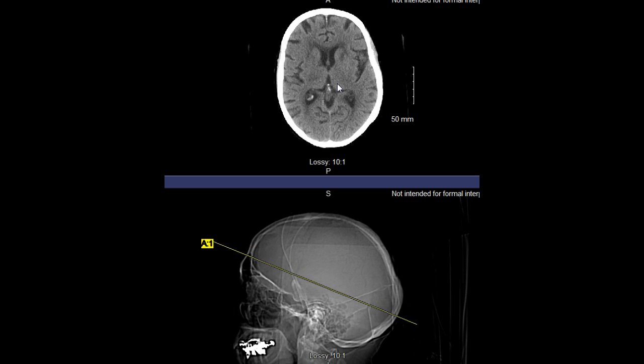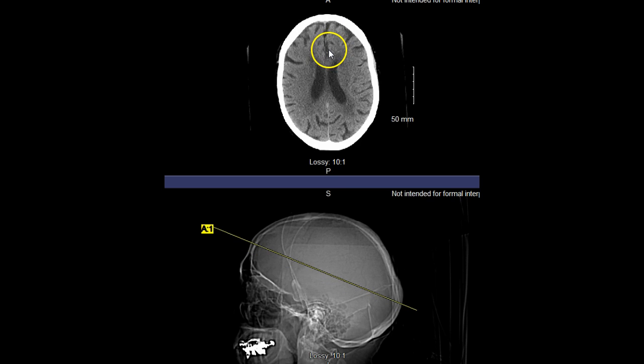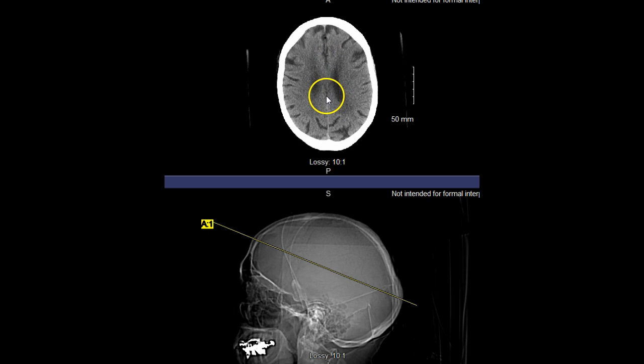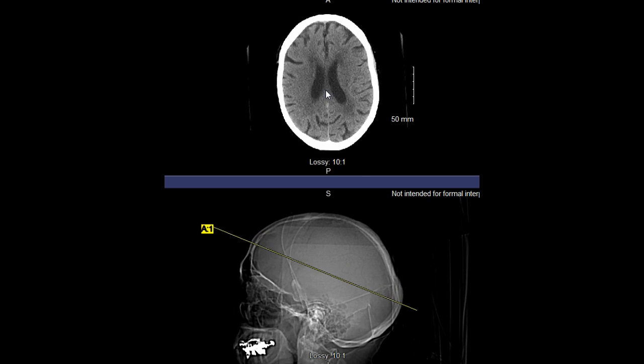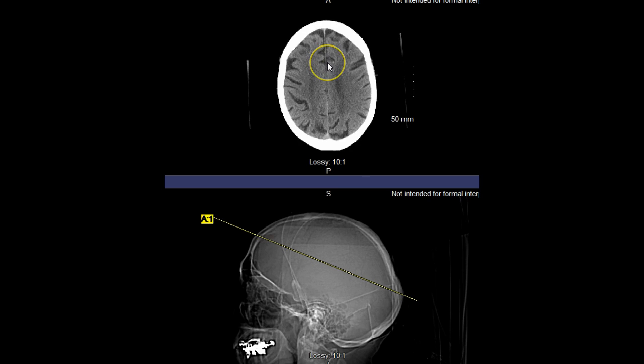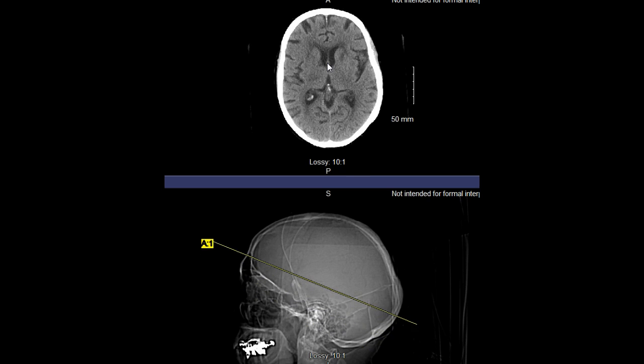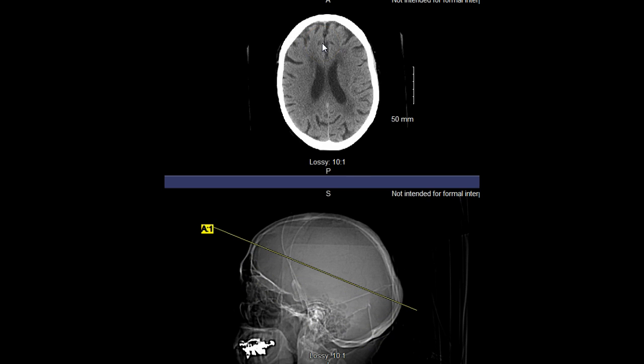The final one that I definitely want you to know is the area of the corpus callosum. So you can see that connection being demonstrated right in through here. We can start to see those connections. You can't quite see that longitudinal fissure all the way through, which is telling us that that's the area of the corpus callosum there. So in a nutshell, those are the brain-based structures.